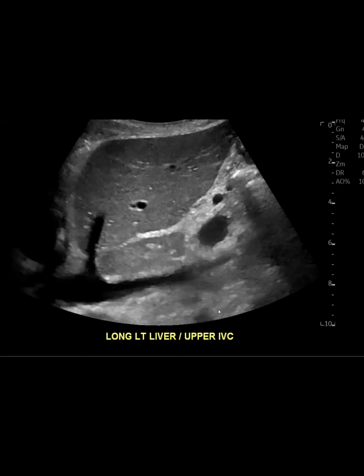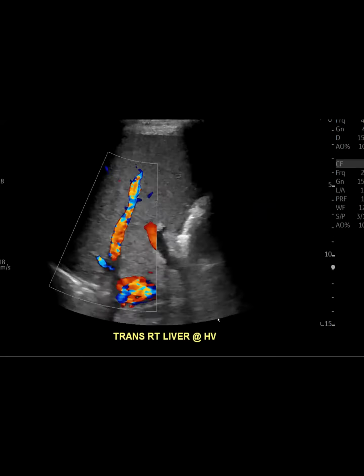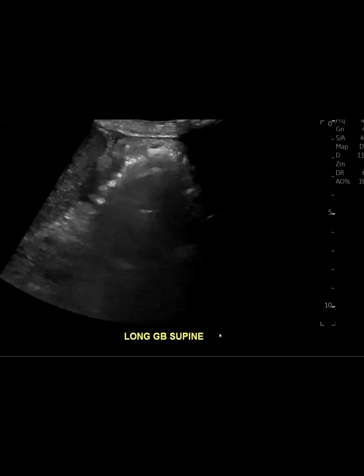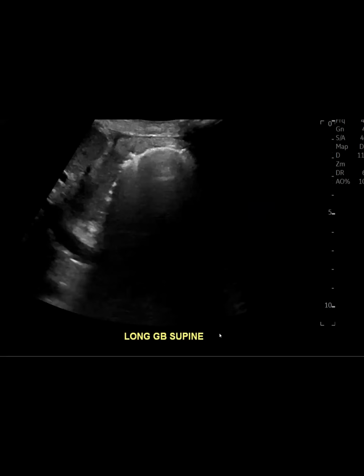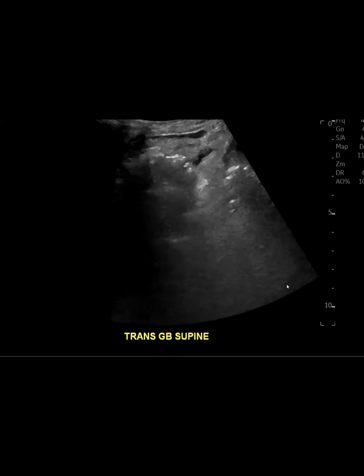Okay, so this is the ultrasound. So what do you guys think here? Okay, this is the region of the gallbladder. Yeah, yes. So it looks like we've got some air within at least the wall of the gallbladder. There's pneumatosis going on. Okay, good.